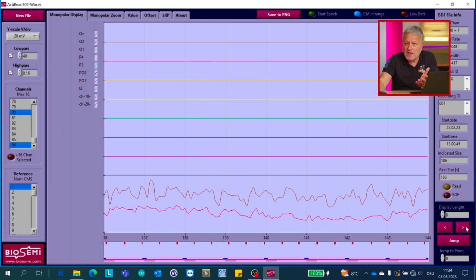That's it. We have a merged NIRS EEG file. We can display it in BESA. It's better than, of course, in ActiRead. ActiRead doesn't give as many functions anyway, but that's okay. May change in the future. But what's important here is we can check the trigger length, we can check the trigger positions, and as we can see, we've done the right thing. We've collected EEG, we've collected NIRS, we brought them together. We didn't have to push a response button every 2 seconds or something.